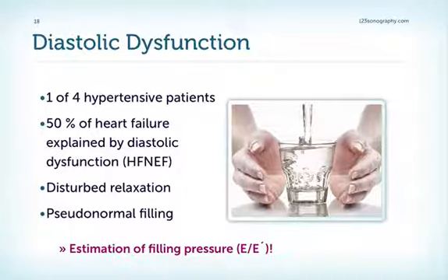Usually, diastolic dysfunction is mild. We see so-called disturbed relaxation patterns, or moderate, so-called pseudonormal filling. Important, as we will see in the chapter on diastolic dysfunction, this will help us to estimate the filling pressure, which is very important also in hypertensive patients.